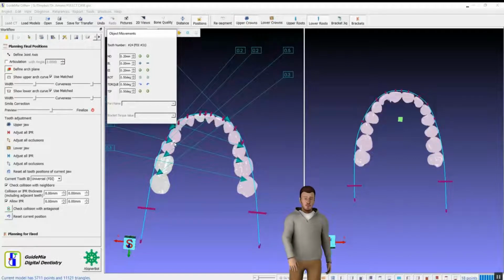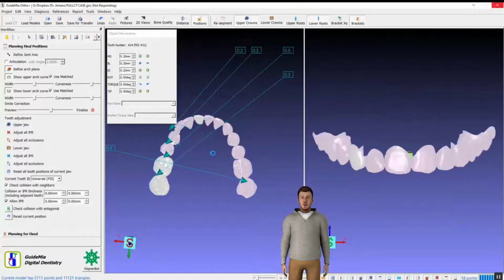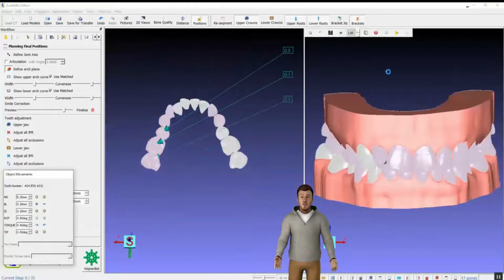setup. We check the views and select the tooth we want to move. The placement widget is now shown. We can drag the handles or drag the tooth directly. If we hide the tissue, we can see the virtual rotation center of the tooth, according to the actual shape. The center can be moved along the axis.